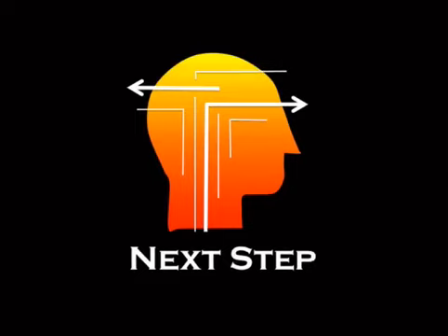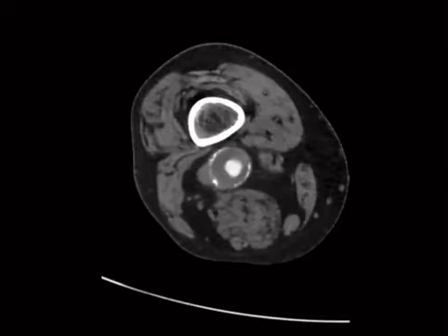So here's a next step question. Okay, so when you see this, what do you think of next? That's the question. So this is an aneurysm of the popliteal artery. If I was going to ask you, what do you want to do next?